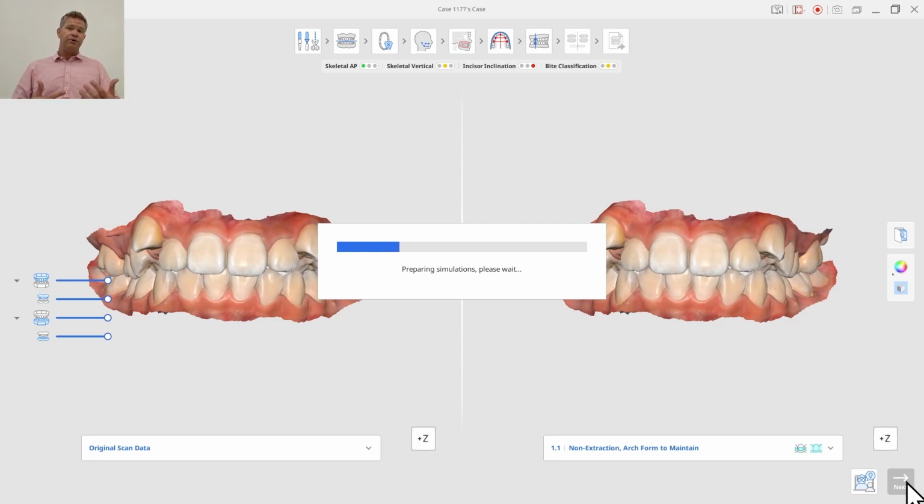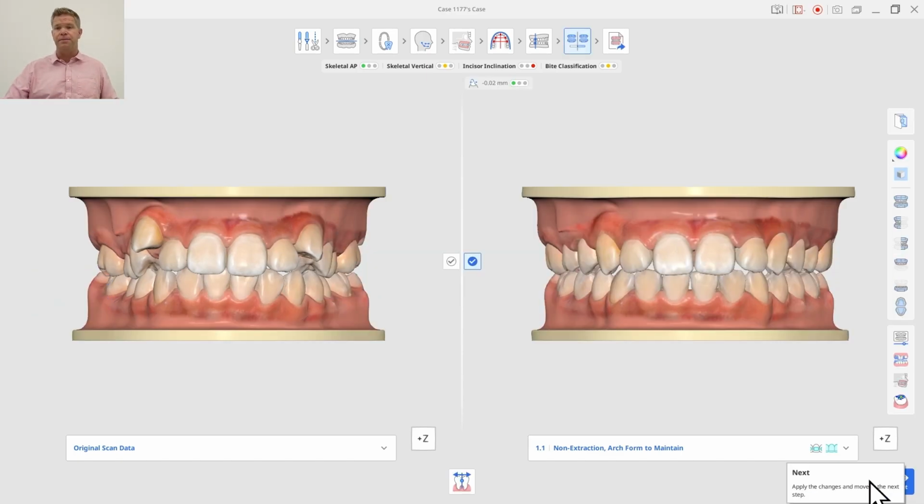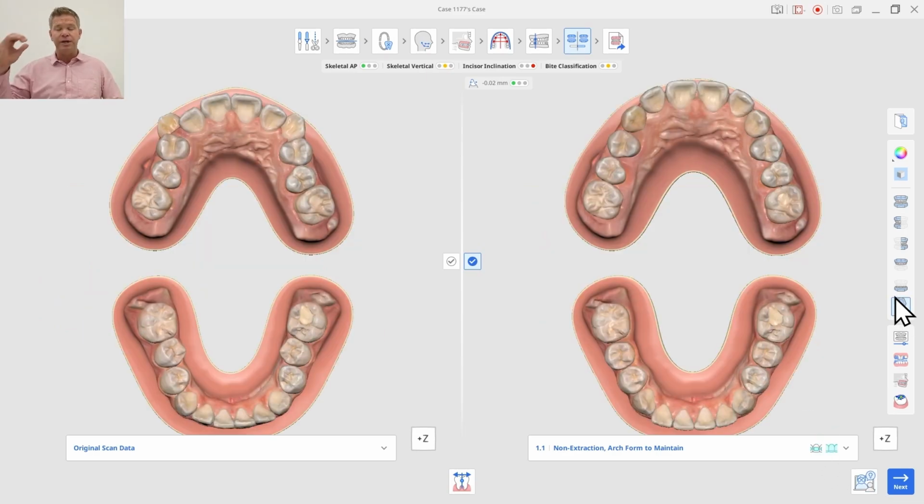At this point, if you're the dental assistant that's been running these simulations and preparing this for the doctor, you probably have the patient in the chair. You're able to do this as you get a little bit of experience. It should take you about 2.5 to 3 minutes to get to this stage. And this is an excellent time to call your doctor in and say the patient is ready for you to start talking to them.